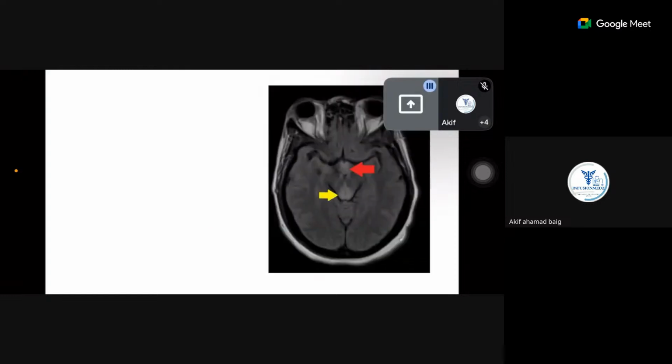Okay, one more common emergency which you all face, especially general medicine residents. I'll give you the history for this case. This is a 56-year-old chronic alcoholic who presented with ophthalmoplegia, ataxia, and confusion. That is global confusion, ophthalmoplegia, and ataxia.